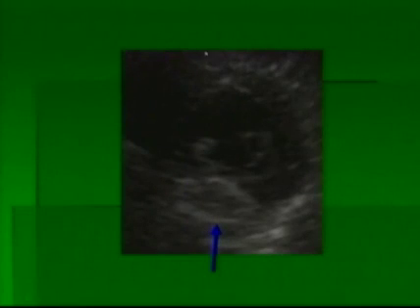Here's another tumor. This is a short axis of the left ventricle. You can see the mitral valve here right in the middle. Down here in the inferior wall, there's a well-encapsulated tumor inside the myocardium. This is a cardiac fibroma. Here's another rather dramatic example, labeled F here, of a cardiac fibroma taking over the heart, essentially.